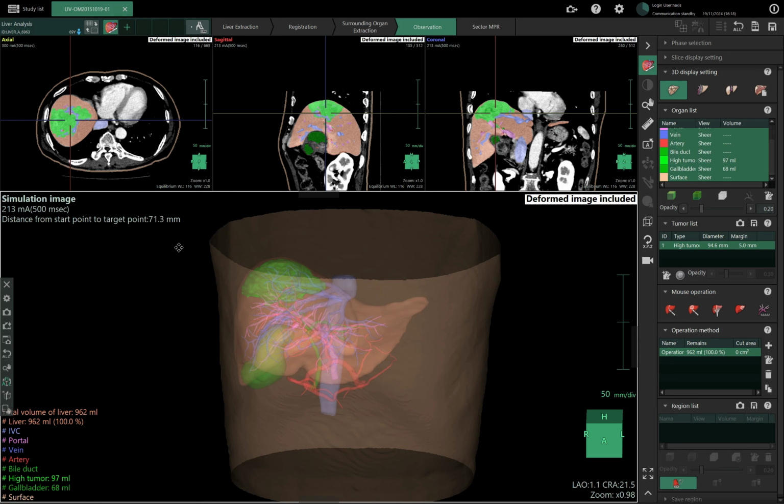It has improved a lot. I swear, I can tell you, because I have seen this from scratch. The extractions at first were bad. And right now it has improved really, really much. The extraction of the vessels and everything is really good.